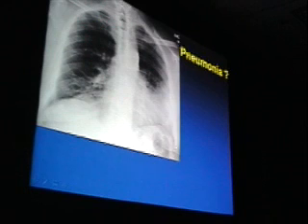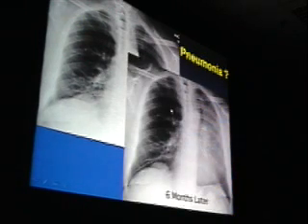One final thought. This patient presented to our ED a few years ago and was thought to have a pneumonia. Clinically, you can see a fairly homogeneous opacity here within the lingular segment of the left upper lobe. Was treated, was told to follow up with their local physician in a couple of weeks. They never came back. Here they were 6 months later. You can see what's happened. They've now collapsed the left upper lobe. Classic sickle sign here, left upper lobe collapse due to an endobronchial mass.